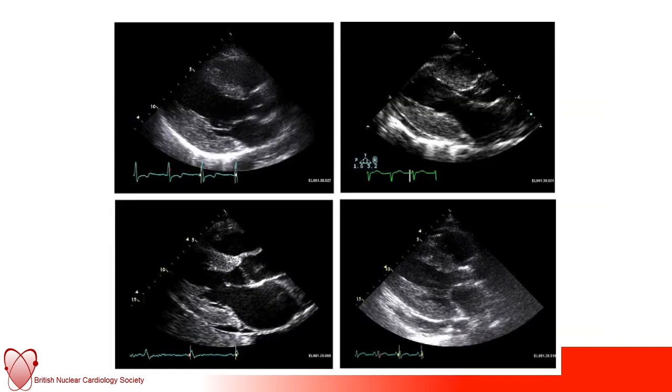You then go ahead and you get these patients an echo, but unfortunately the echo findings, although they can be quite classical when seen, can also be very non-specific, and here you're looking for some degree of left ventricular hypertrophy, impairment of longitudinal function, biatrial dilatation, possibly a small pericardial effusion. You may find some RVH as well, but it becomes difficult because other conditions can mimic this. Hypertension, for example, aortic stenosis can also. And I would challenge anybody to look at those 4 images and tell me which of those is cardiac amyloid.